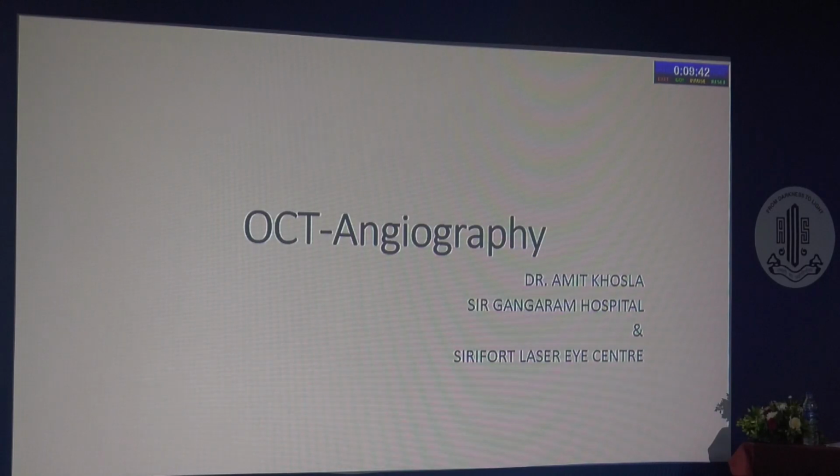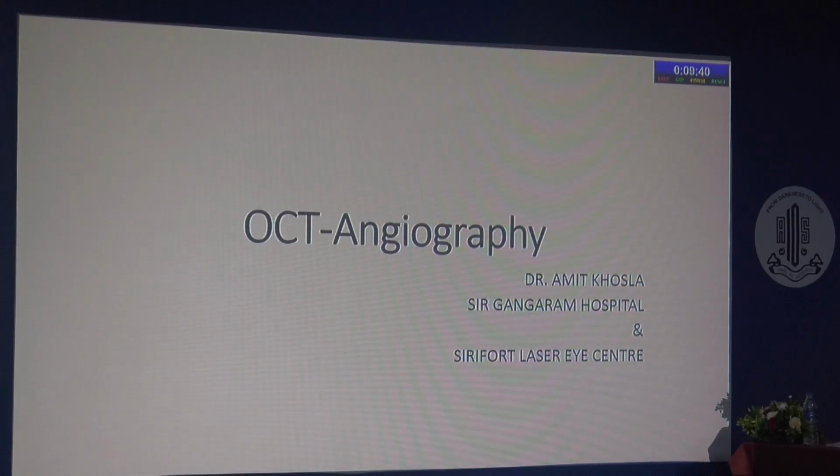Number 2 is what is the vitreomacular interface? Can you see a membrane or not? Number 3 is the thickness. You may have no edema, you may have a normal contour, but you may have a thickening or a thinning. Number 4 is the IS-OS junction, which Dr. Jha showed, the small one. If that is injured, then you have damage to the retina.